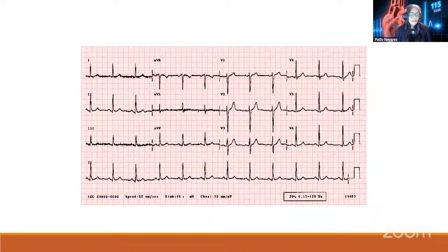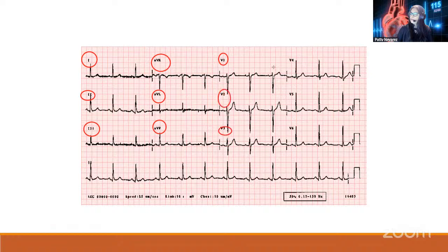So this is what an EKG strip looks like. Let me get my image here. There you go. So we see here lead 1, lead 2, lead 3, and then we have aVR, aVL, aVF, and then we have the precordial leads, V1, V2. I'm going to circle them all just to make sure that we cover V4, V5, and V6. That means that all the information that we gather from all areas of the heart is going to be represented in a 12-lead EKG like this.